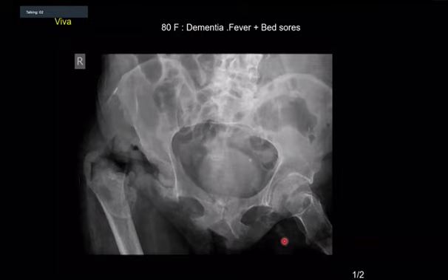Other than that, the sacroiliac joints are congruent, no abnormality there. The left hip joint is congruent. The joint space is preserved. And then there's a right superior pubic ramus fracture as well. What is your conclusion? So I think, the way the destruction is, I'm thinking whether there has been an underlying infective process with erosion of the head and the soft tissue.